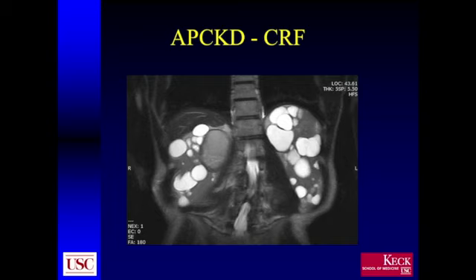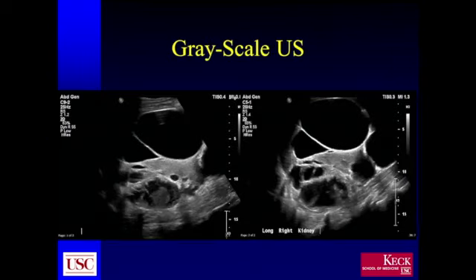failure. You can see these multiple cysts identified in the enlarged kidneys on the non-contrast T2-weighted MR, but you can also very easily see that there's one of these cysts that clearly has a very different signal intensity and was of concern. On the non-contrast ultrasound, I think our concerns grew in that you can see here that there are various thick and nodular septi. There's a large mass-like area centrally. The walls of this structure are shaggy.